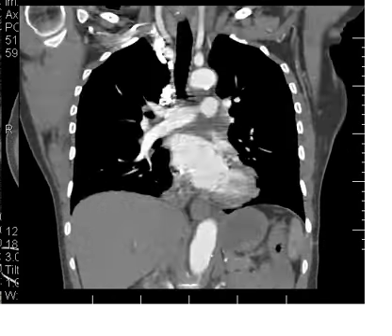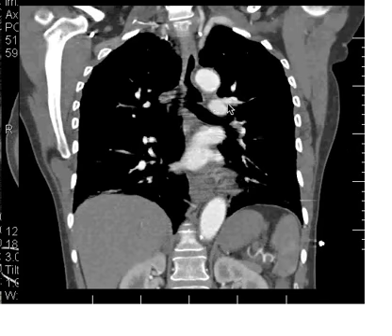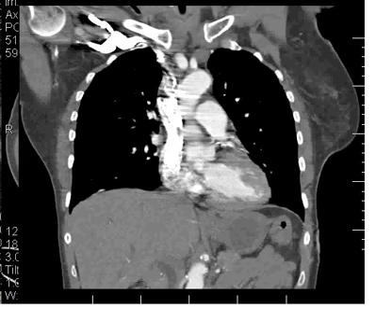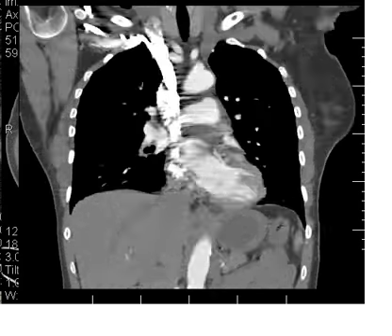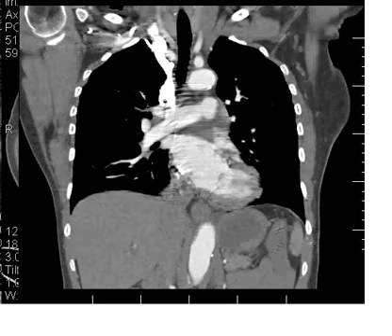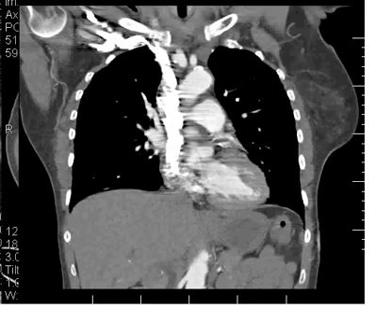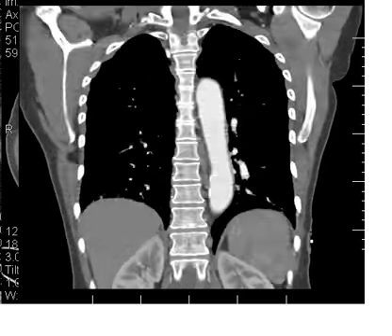and more posteriorly here, and in some of these little branches here. So for a quick overview, that kind of gives you an idea of what we're looking for. So the key is to get your comfort level with the anatomy and know what you're looking at and key off things like the aorta, especially the aortic arch, and confirm your orientation and your vessel identification with things like the superior vena cava. Okay.